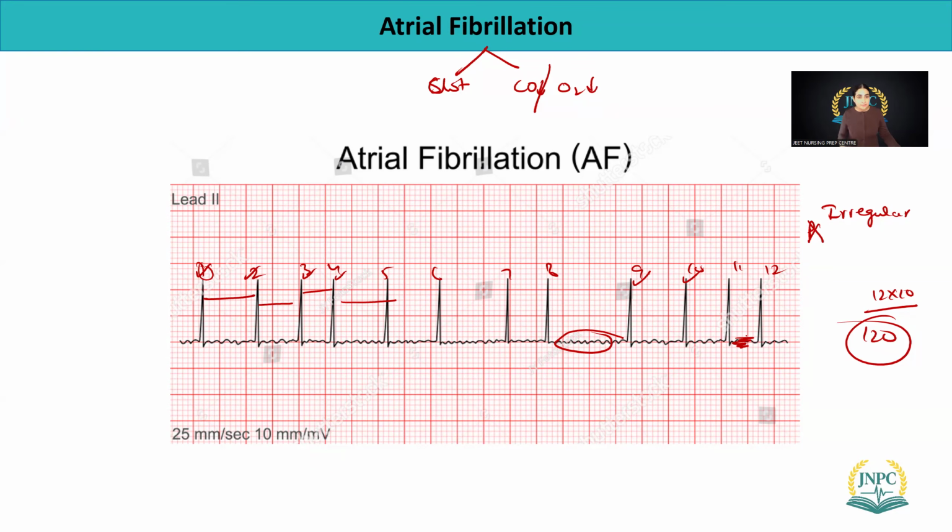Ventricular rate is high. Atriums are quivering, and if you have to really see, or let's say if we are guessing, there are like 3, 4, 5 ECGs, and calculate, there could be a lot. So atriums are like shivering, like it could be 300 beats or maybe more, but we cannot locate that, right? We cannot really guess, but on guesswork, we can think atriums are just shivering.